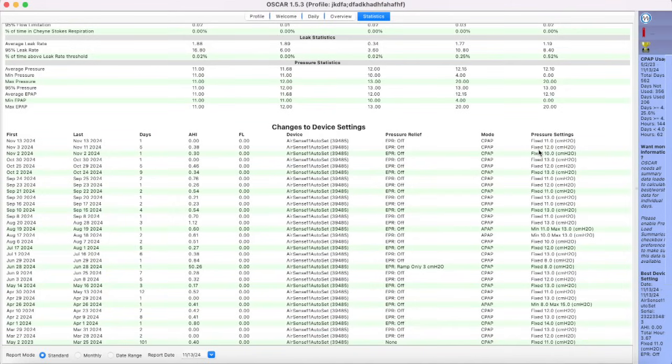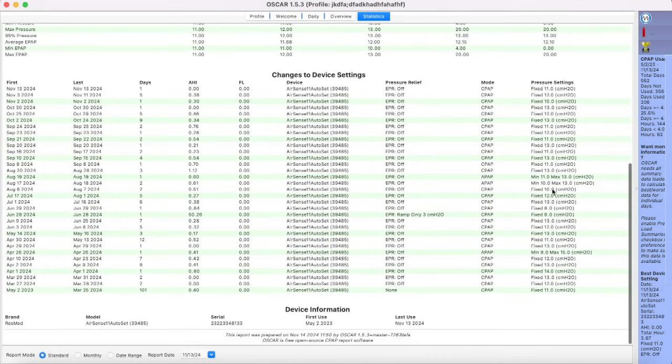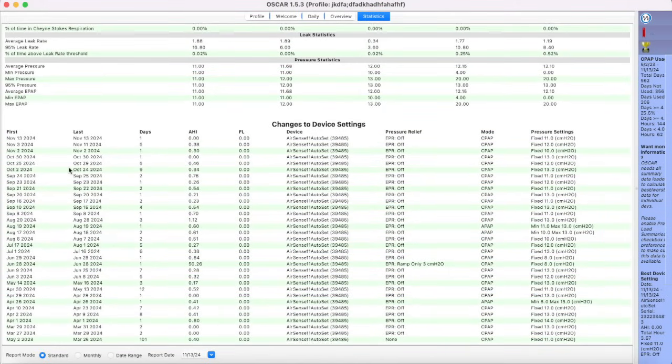Like if I'm working with patients through my website, axgsleepdiagnostics.com, if you want a PAP therapy analysis, I can go and look at what pressures have been sampled. Was EPR on or off? What was the pressure? Was it fixed? Was it auto? Like, what happened? So sometimes I want to see, God, I see they did 10 and we've been working with 10. God, I sure would like to see 13. Oh, look, they tried 13, and I can say, look, they tried 13 on the 30th.